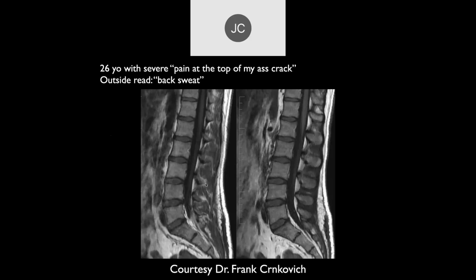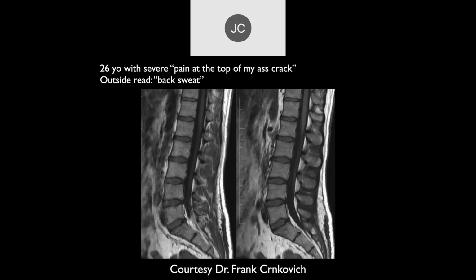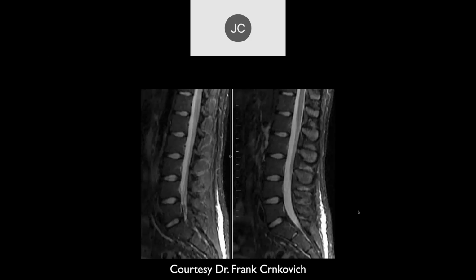Well, I think these are two adjacent cuts, and then I think this is what he's talking about. It's the STIR sequence. So here's T1, and there's STIR. Actually, this is probably T2, and this is STIR. Yeah, some increased signal there in the superficial soft tissues. It looks like fluid.